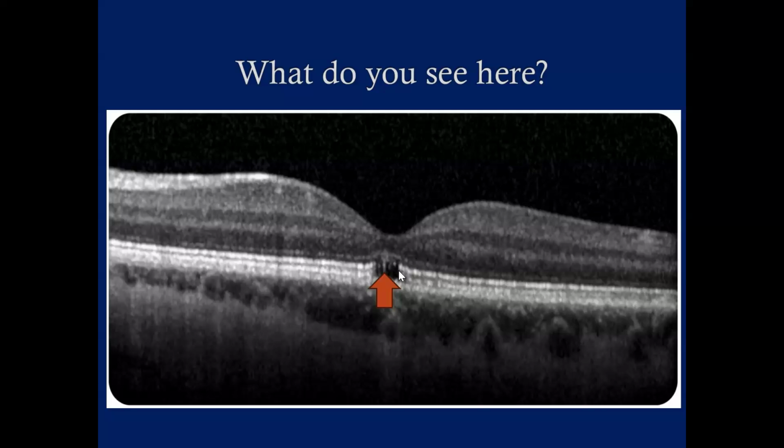No, I will continue. This is a big defect that you see here. The photoreceptor inner-outer segment complex is lost. This mostly happens following photocoagulation effect, and that is most likely of solar retinopathy or from any laser spot damage. So this patient loses the photoreceptor layer here.